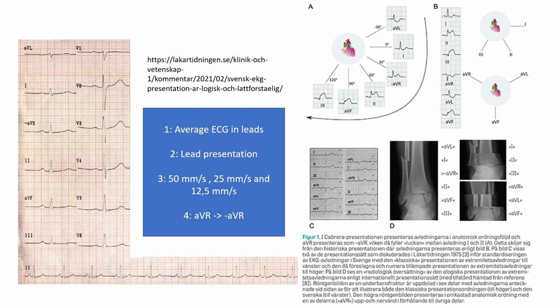So when you're calculating the rate and when you're using your gestalt to see whether or not this is wide, remember I said the QRS is 3 small squares down here? Well, this is 6 small squares now, right? And everything is double. The reason why, and I can see some articles mentioning this, is it's good for certain interpretations where you can't see the small things, such as if you want to see an epsilon wave, for instance, it's better to have it much more zoomed in like this than having it in 25 or 12.5, right?